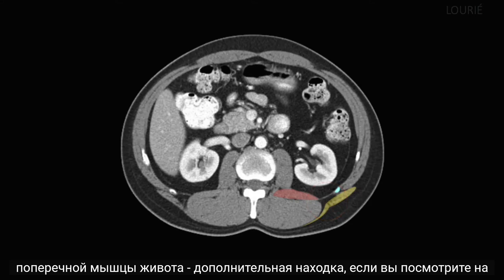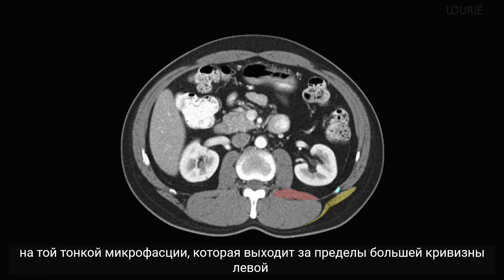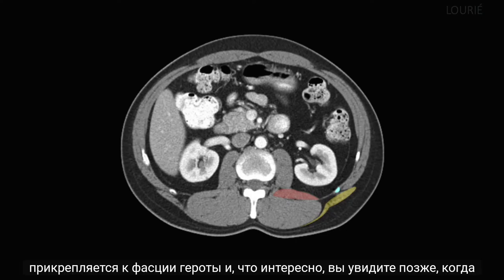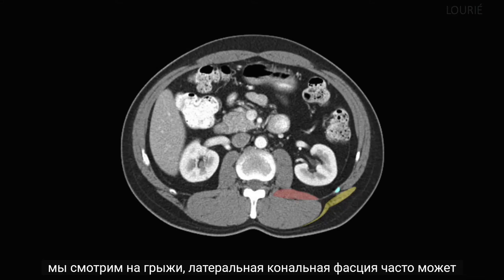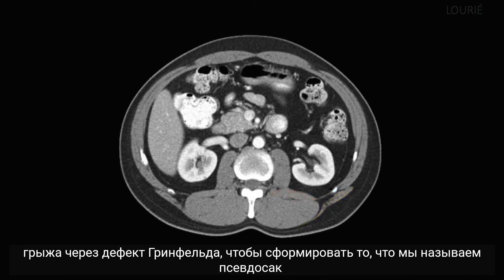An additional finding, if you look at the descending colon beginning at the white line of Toldt, look at that thin microfascia that extends beyond the greater curvature of the left kidney. This is the lateral conal fascia attaching to Gerota's fascia, and interestingly, you'll see later when we look at hernias, the lateral conal fascia can often herniate through Grynfeltt's defect to form what we call a pseudosac.